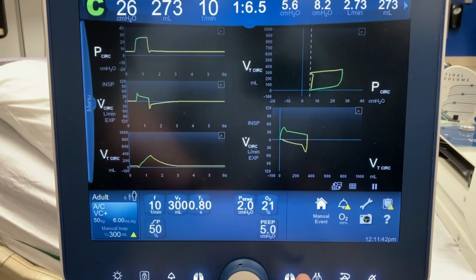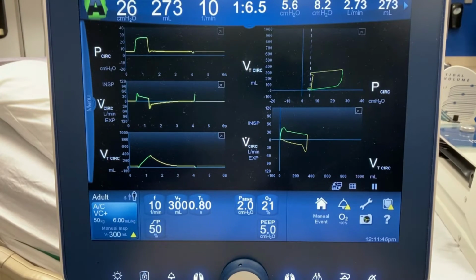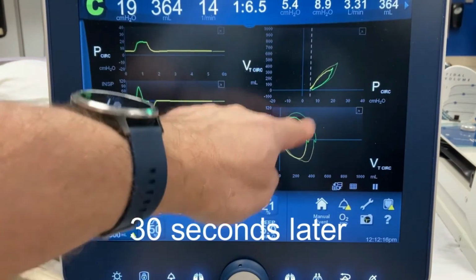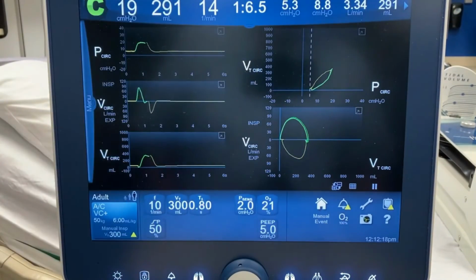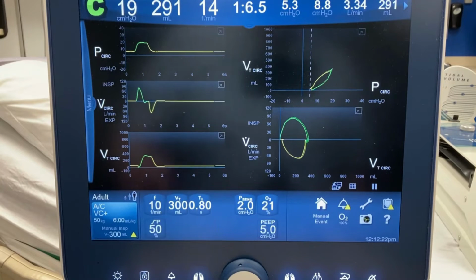So let's go ahead. I'm going to take the resistance out for a second and show you this. Oh, and look, our loop is back to the same. We've got a skinny pressure volume loop. Okay, now we've got a peak of 19, and I took the resistance out, and it's just blowing into open bellows there. So there's really a negligible amount of resistance there.